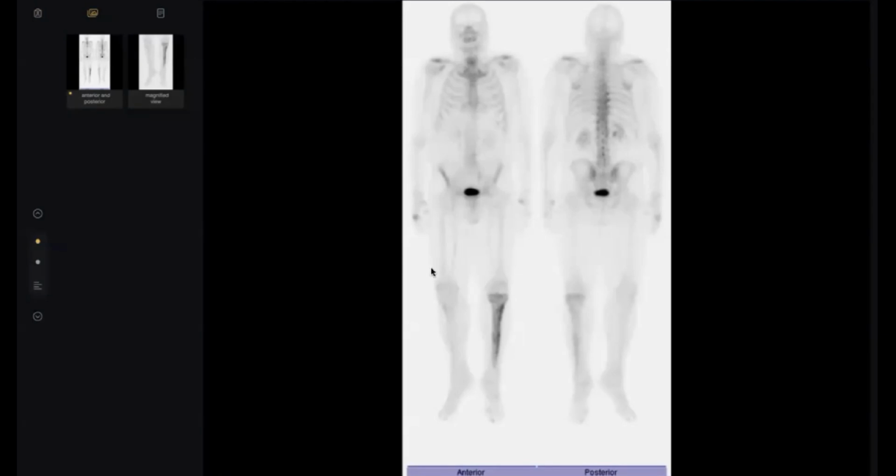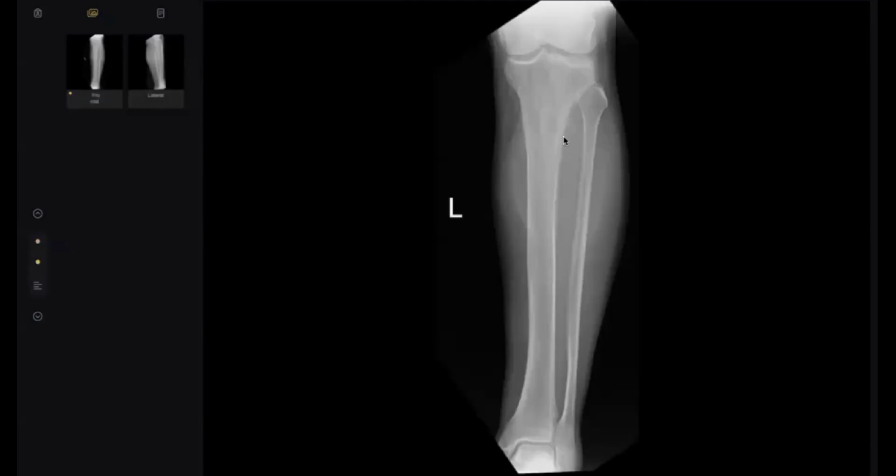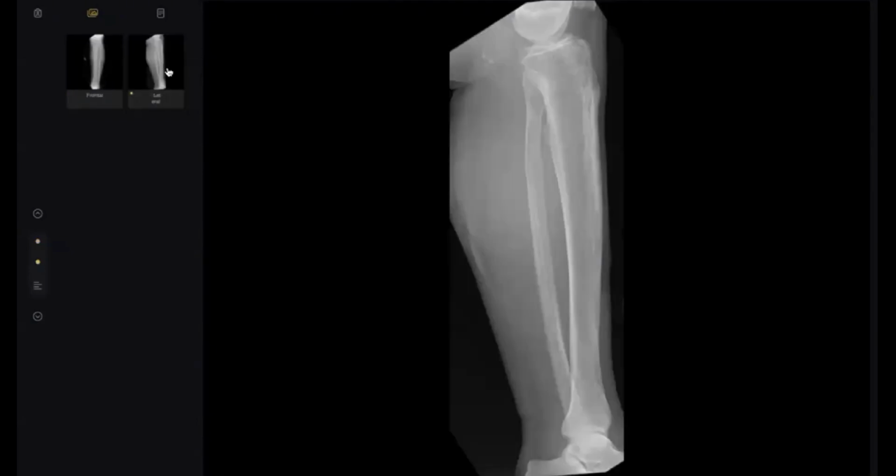What's your next step? I would correlate with the radiograph of the patient. Tell me what happened here. I can see that there is a lucency in the proximal tibia with thickening of the trabeculations and the cortex. So this correlates with Paget's disease, given the old age and the lucency with thickening of the cortex and trabeculations. So this is more towards Paget's disease. Thank you, doctor, so much. It was Paget disease.